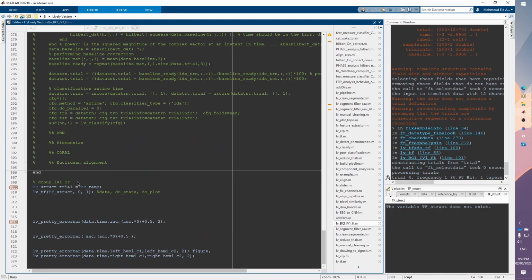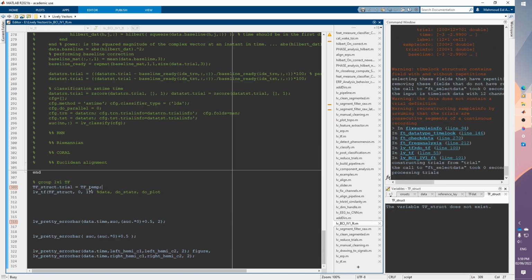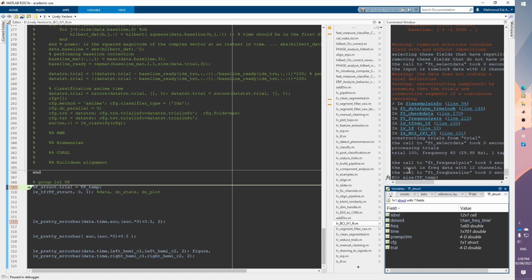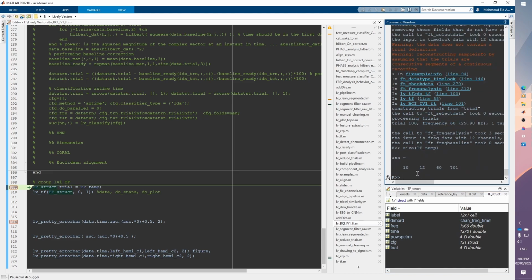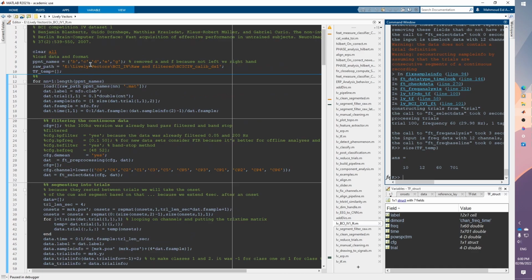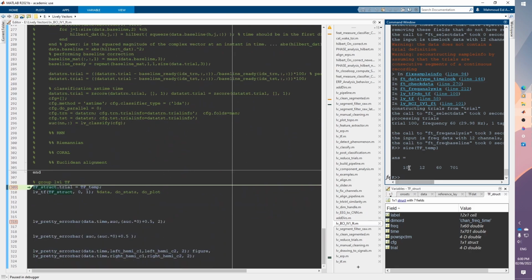I'm reaching the end of the for loop here, such that we will look at this, because this should include the aggregated data from all participants, and each one of them is having two rows, so two conditions in the first dimension. We can then check the size of that when the code finishes running. So let's check the size of that, and because we are looping on 5 participants, each one of them containing two conditions, we have 10.